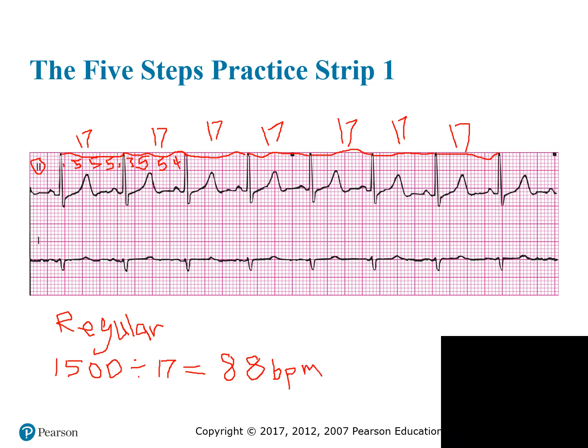So our next question asks, now that we determined, so let's go back through 1 through 3 question. First question says, are there any QRS complexes? We have established, yes, there are QRS complexes, and that they are the same shape. Yes, they are. We determine next one is the rhythm regular but interrupted, or irregular? We determine that this particular rhythm's regularity is regular. Once we determine that, our next step is, what is the heart rate? We determine that the heart rate is 88 beats per minute.